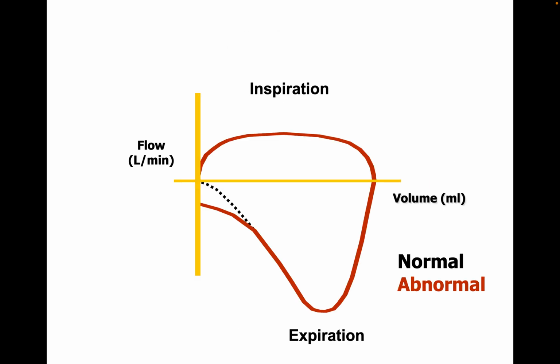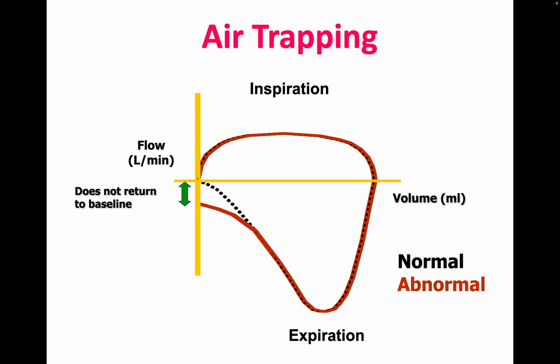Similarly, in this particular flow volume loop, the expiratory loop is not touching the baseline. There is some gap, and this is classically seen in air trapping.